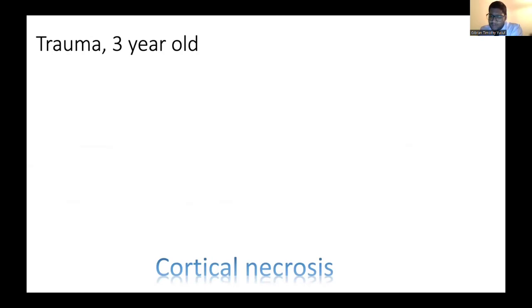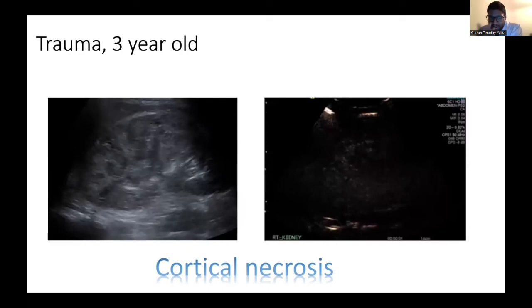And that's the sort of image you can put across in MDTs to show a representative. This is another renal trauma. Again, you can use it for liver trauma, splenic trauma, anything really, but particularly in the follow-up.